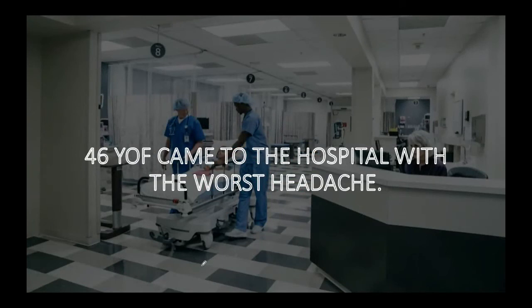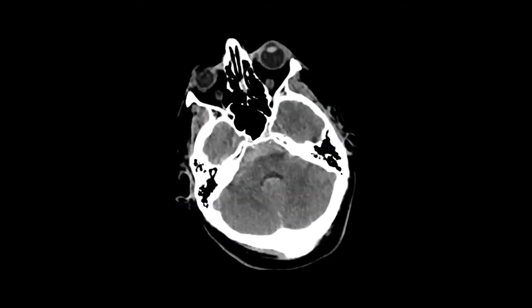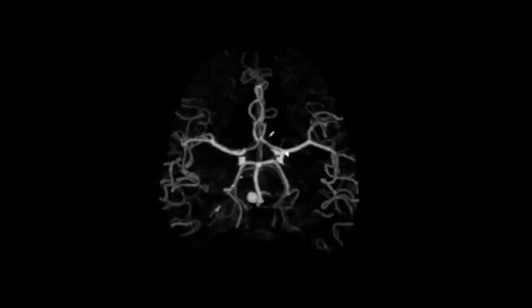A 46-year-old female came to the hospital with the worst headache. And this is what we saw. Due to time, I'm just going to go over it. This is subarachnoid hemorrhage because it's in the subarachnoid space. It has hyperdensity in the cisterns. It's anterior to the prepontine cistern.